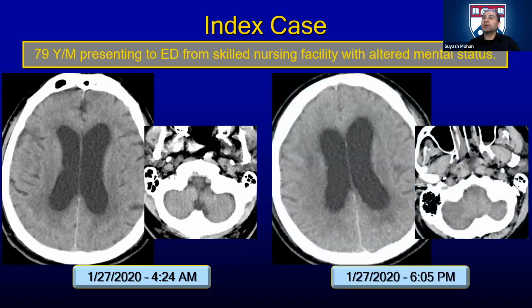Now, the patient kept on deteriorating, kept on declining. A few hours later, I have the date and time, they came back for a repeat head CT, right? And the person who was looking at this head CT, we all are very busy. When we get a normal-ish looking scan, the intent is to read that quickly so you can save time for more difficult cases, right? So again, what the person who was looking at this case did was just cut and paste the previous report, right?